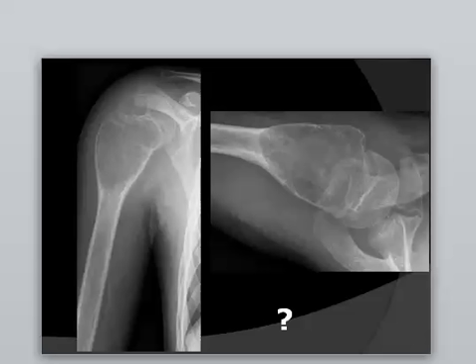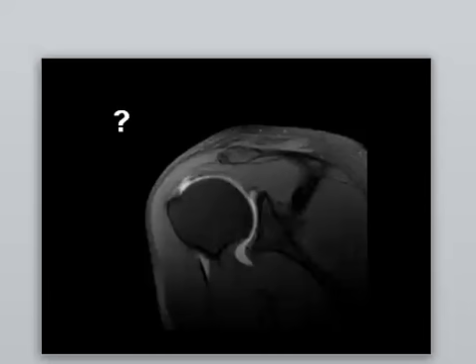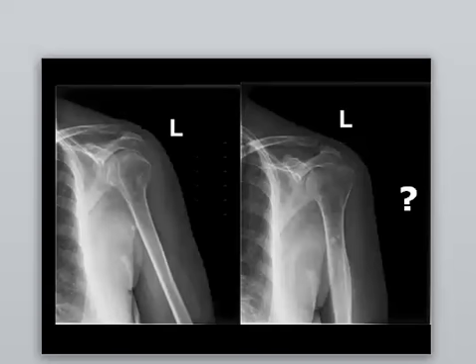But of course, you put also simple bone cyst as a differential diagnosis. So what is this? This is a supraspinatus tear. And what is this? This is the pectoralis major, and here it is dense.